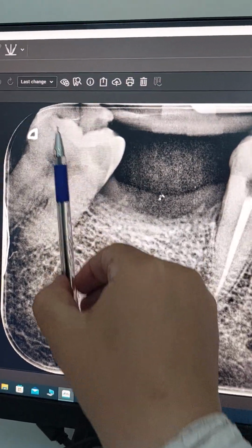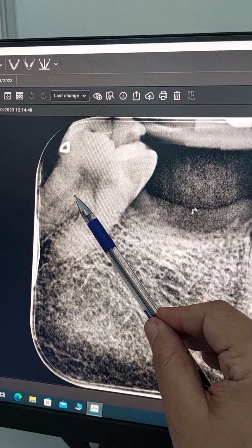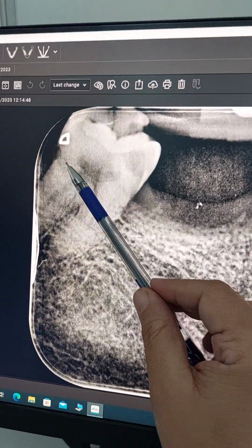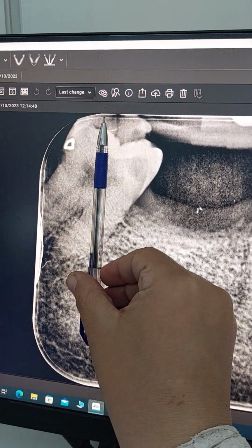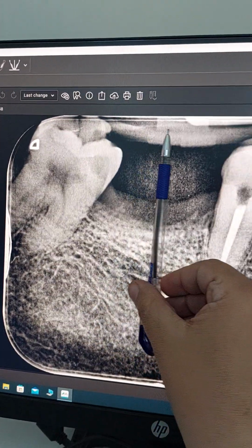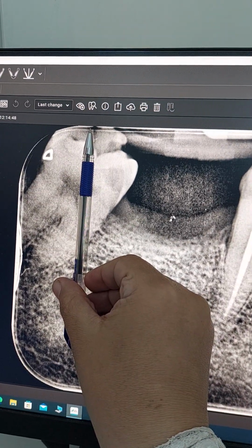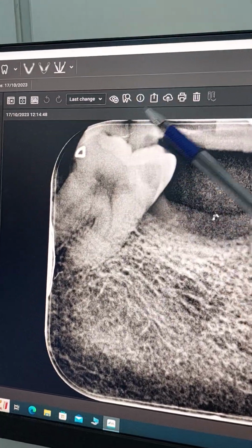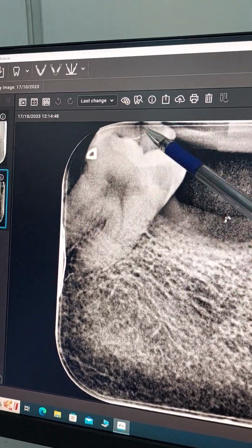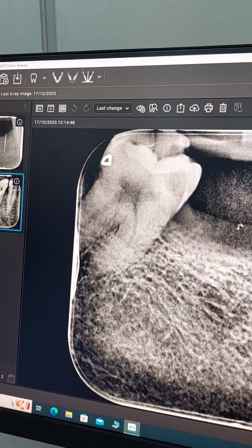Okay, because usually when the teeth rotate, they rotate around the axis. So wherever their roots are, this was their original position. Okay, so this might be the 8. Look at all of this space. Is this all space of a 6? No. I know, looking at the morphology, this is a wide crown, separated cusps, separated roots. But we do have 8s with separated roots, don't we?